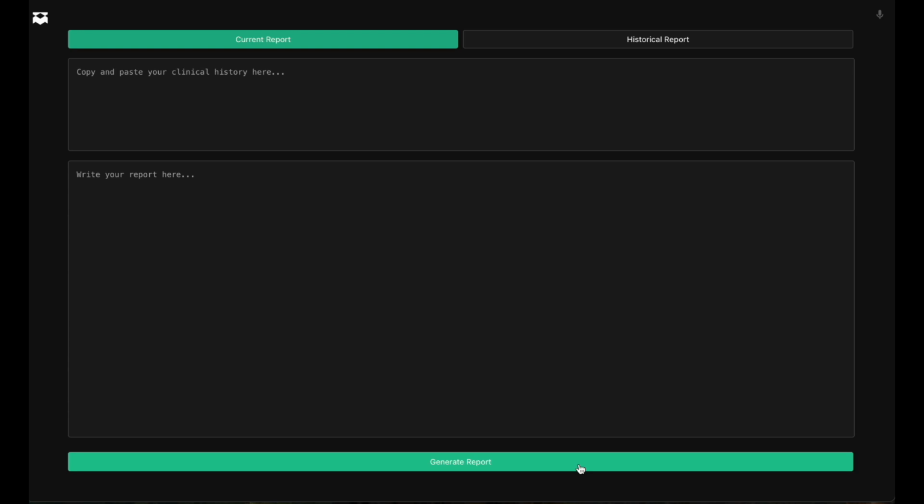My name is Ab. I'm a co-founder of Radnomics, and today I'm going to walk you through some exciting new features in RadCopilot, our AI-powered reporting assistant, designed to help you write clearer and more effective radiology reports.